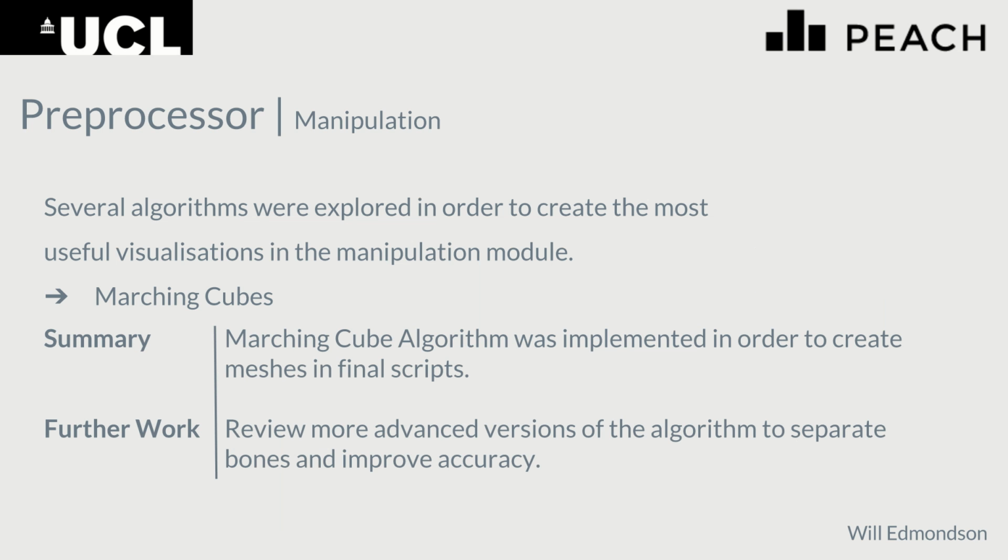In summary, the marching cube algorithm was implemented in order to create the final meshes. More advanced versions of this algorithm do exist, and they could be explored in the further work.